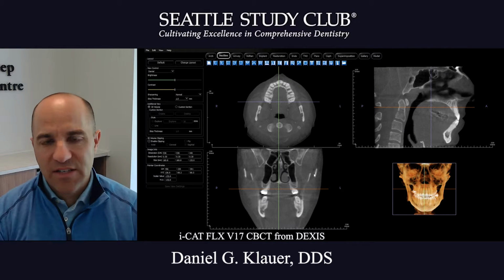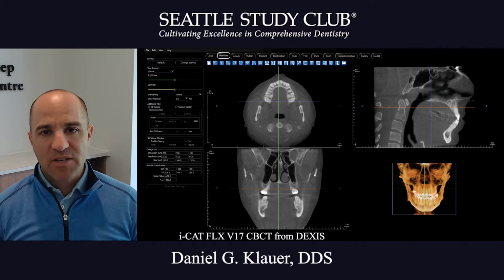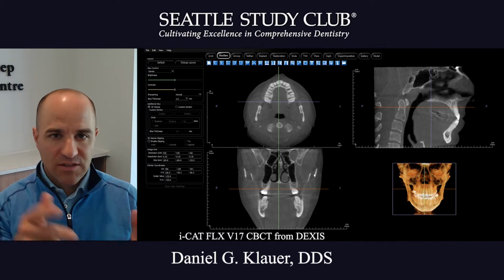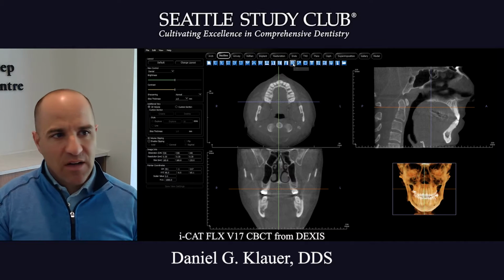Hey everybody, today I just wanted to review a quick overview of how we look at cone beam images in a clinical setting and what we review with the patient. So I'll just hop right to it. When I get the scan pulled up, usually my team does this, but I'll show you.